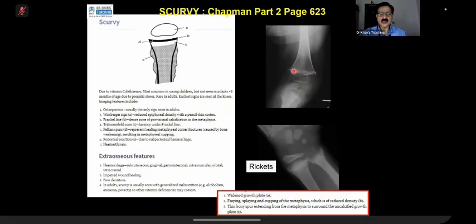This calcification is normal, but it gives a slightly fluffy appearance because calcium is normal. And then the Trümmerfeld zone is lucency under the Frankel line, not very well projected in our example, but you can imagine that somewhere here is a lucency under the Frankel line.